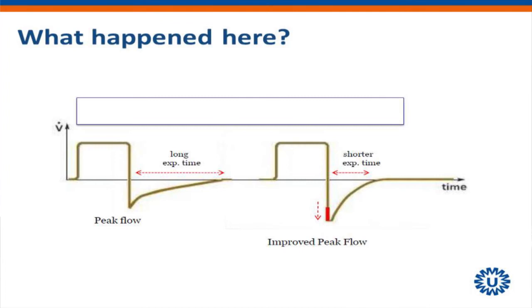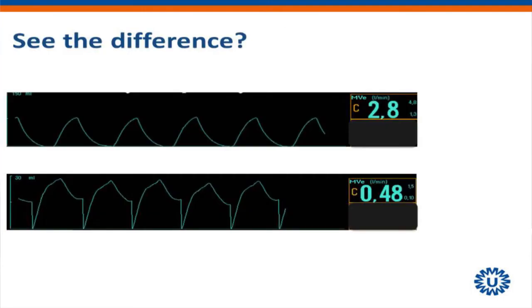Patient received, I don't know, Ventolin or something else, but expiratory resistance was fewer here. When we're looking at the flow waveform, you can immediately see that something's different here than here. What is different? This is the normal volume curve. Here you see an enormous leakage.